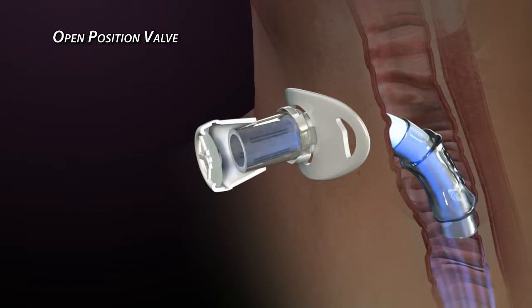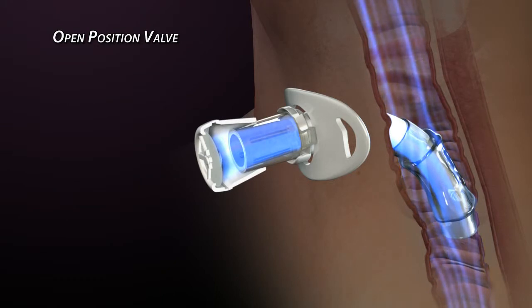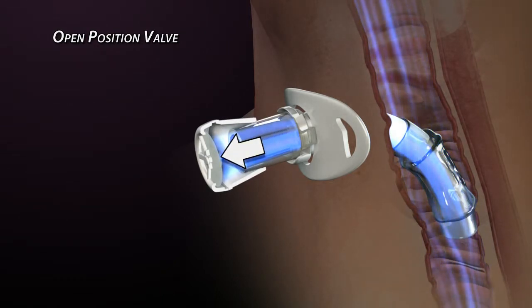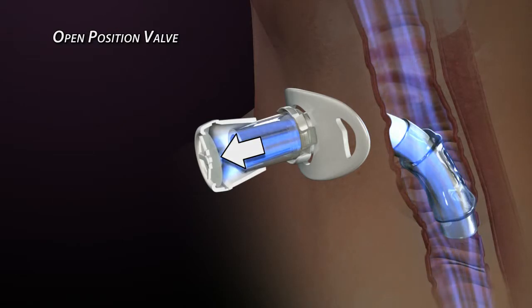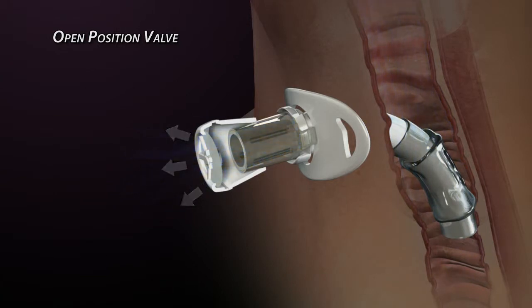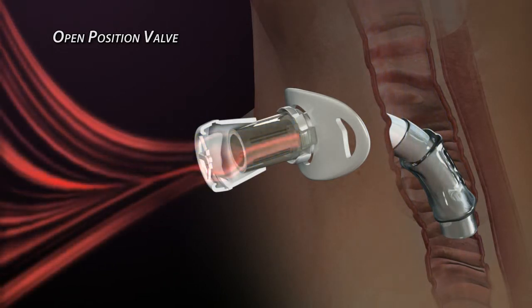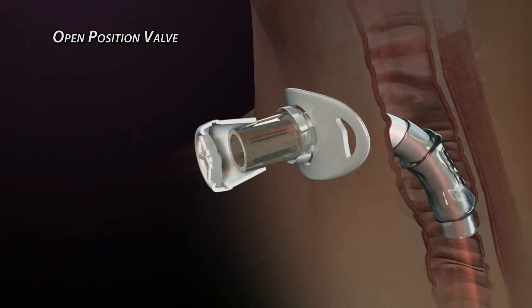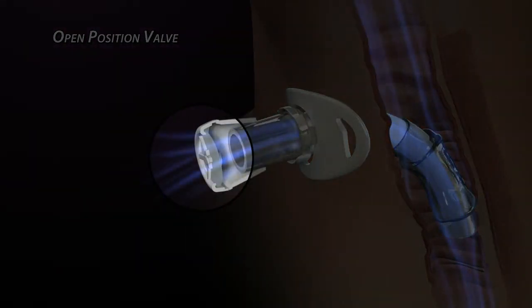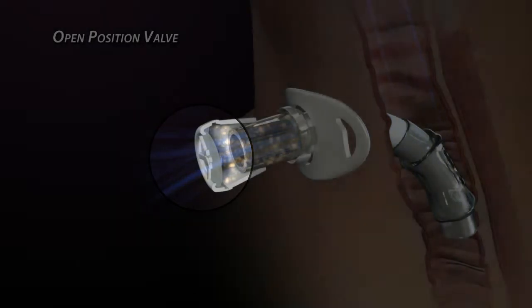Reversed airflow, which is produced by exhaling, is necessary to force the membrane against the valve body to produce a seal. Before the membrane actually closes, there is a short time lapse where some exhaled air can escape. In addition, some common breathing patterns create an airflow phenomenon that can cause the membrane to vibrate or oscillate, which prevents it from completely sealing, resulting in noise as air leaks out.